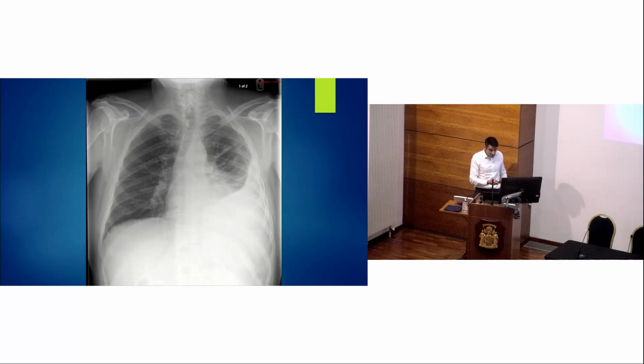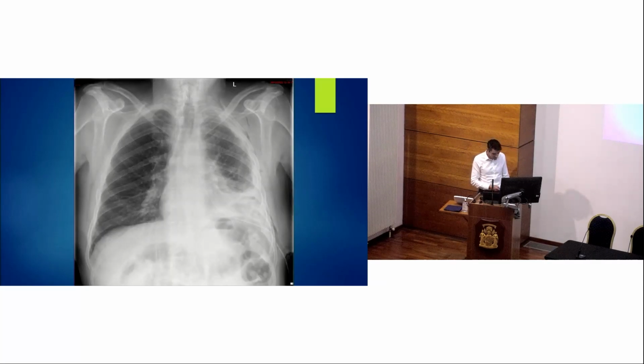Well, this is quite a common thing we'll see first up, and this is a large left pleural effusion. So pleural fluid collects in the pleural space as a result of the tumour, and we get this classic meniscus sign, and that's quite often what we'll see early in the process. The chest X-ray is also useful because we can use it to monitor treatment of these effusions. And here's the same patient after the insertion of this chest drain, and you can see that opacity down there has largely gone because that effusion has been successfully drained.